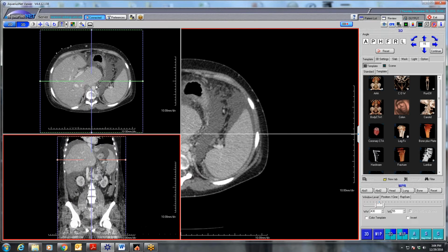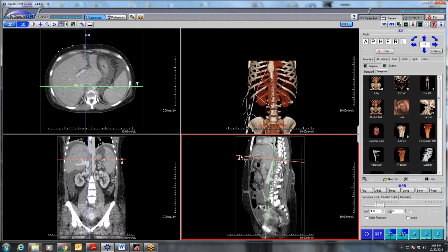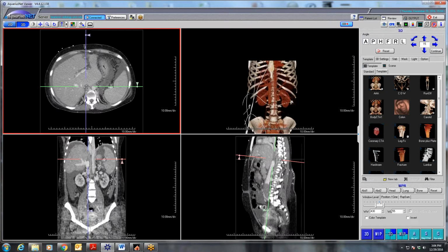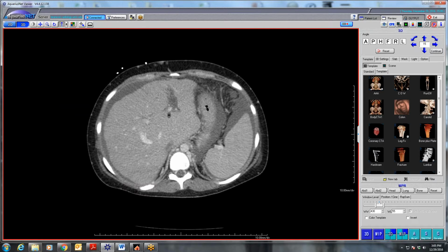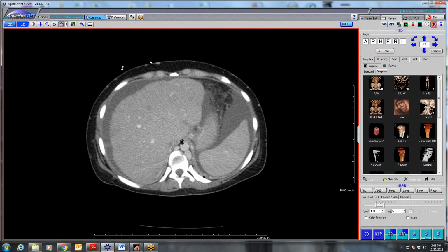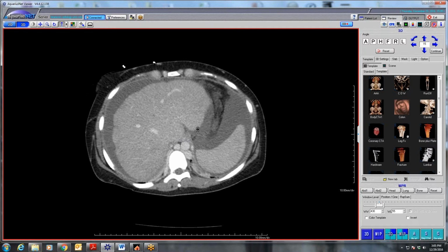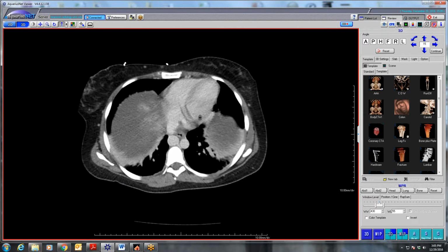Then you can see as we get to the intrahepatic segment that there's complete absence, thrombosis, atresia of the intrahepatic segment. So this person was diagnosed, and this is the diagnosis she's been treated with, as congenital absence of the intrahepatic portion of the IVC. We were looking it up. It comes from a separate remnant, the vitelline vein. The suprahepatic portion is present.